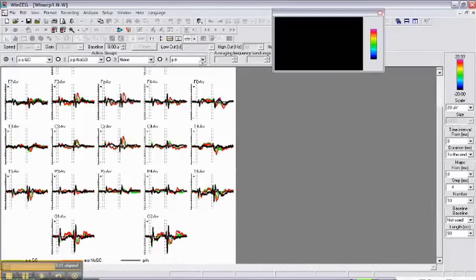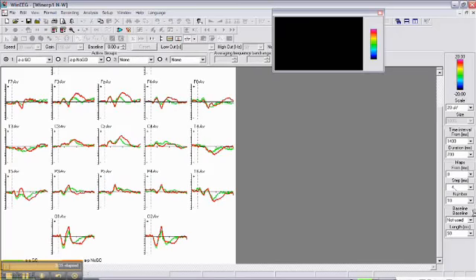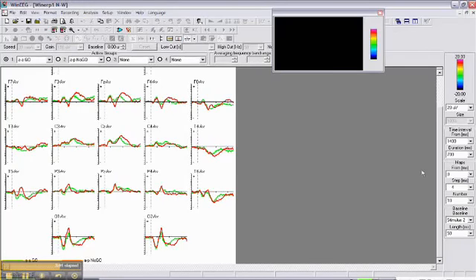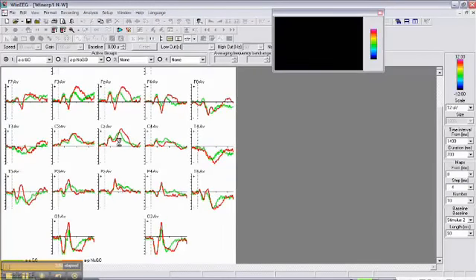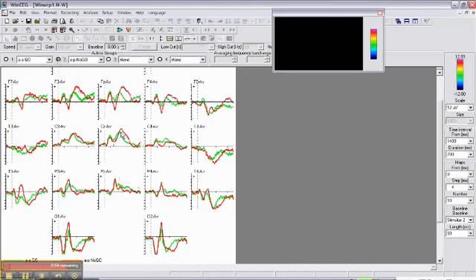And let's select the second stimulus presentation and only go no go condition. So this is ERP for go no go condition. Now we correct the baseline from the second stimulus presentation. And here we see these ERPs computed for go and no go condition. Green is go condition and red is no go condition. We can map the amplitude, the maximum of the potentials in go condition, in no go condition.